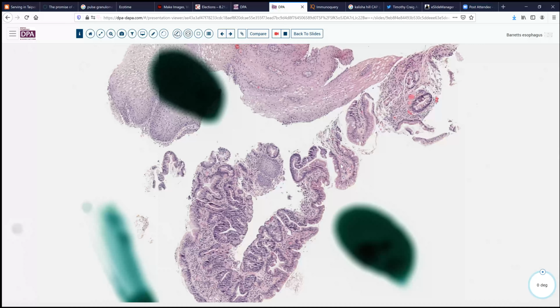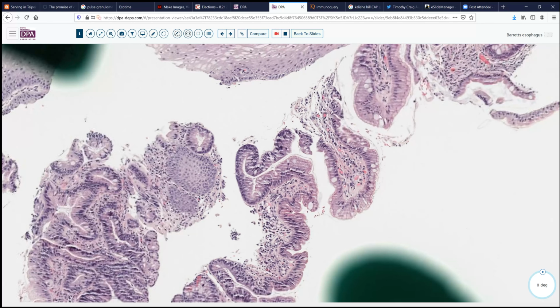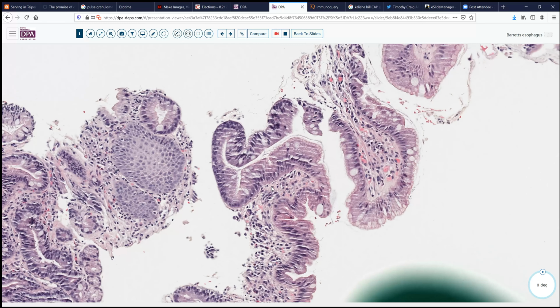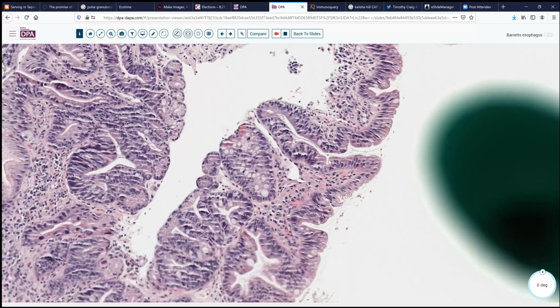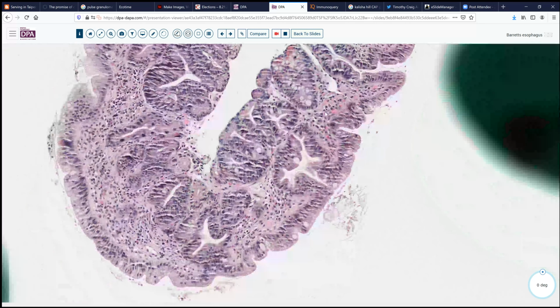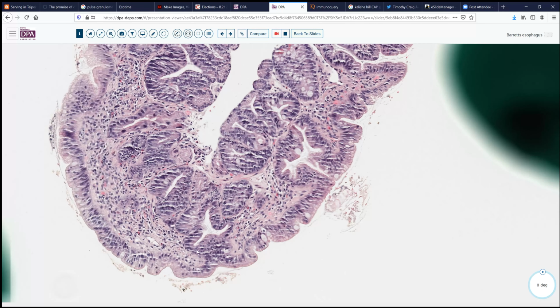We see columnar mucosa with areas of true goblet cell metaplasia. And typically these true goblets have just a very pale blue tinge to them, whereas pseudogoblets, sort of more like this over here, would tend to have a more pink or pale appearance. And so that can be helpful. So here we see intestinal metaplasia, and then going to our next criteria, do we have architectural abnormalities?